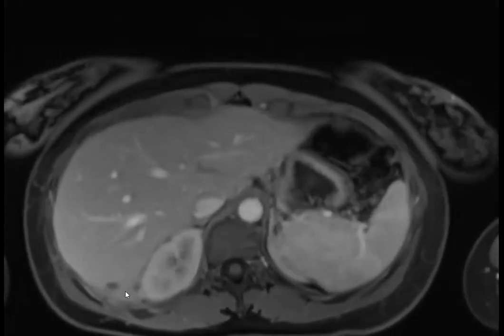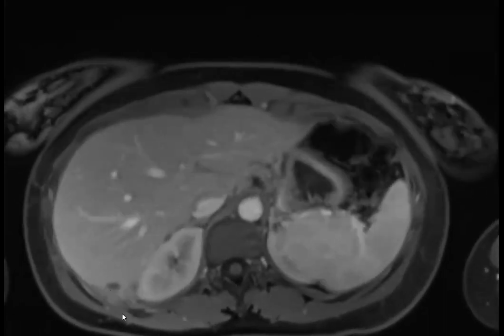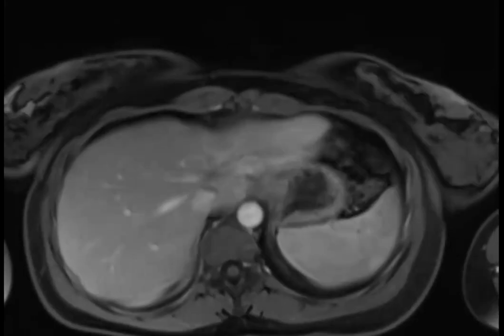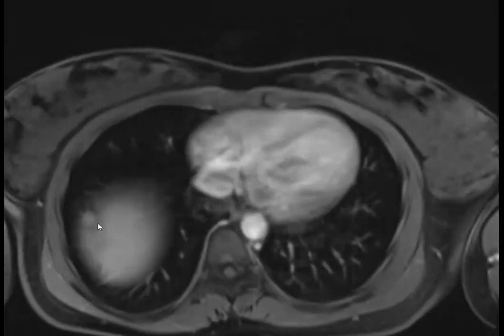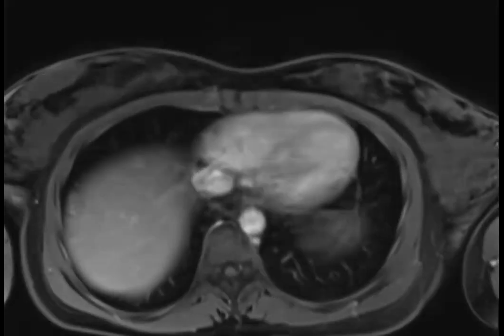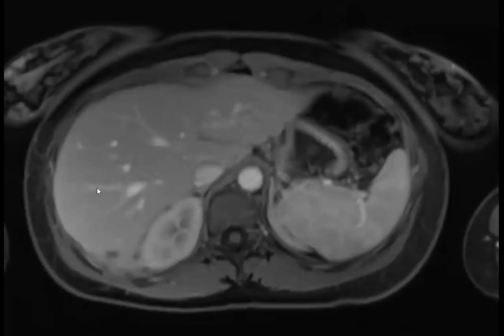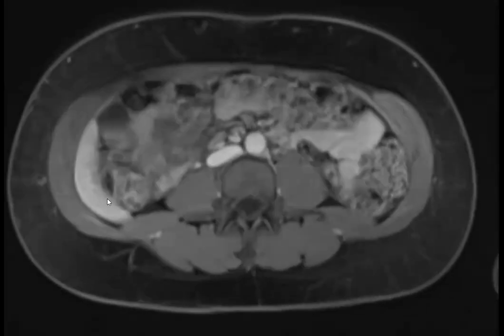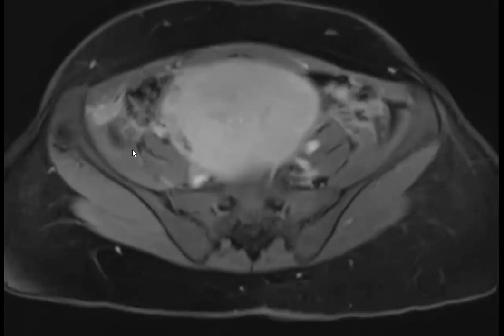And this enhancing stuff on the liver capsule, kind of almost going into the liver, is deep infiltrating endometriosis, invading into the liver here. So this is at risk for traveling into the pleural space and causing a pneumothorax, these deposits along the liver edge. But it's just a really nice example from one of my colleagues of how extensive it can be, and it can often go up the right side.